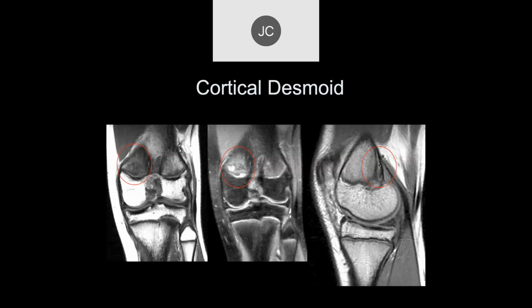What about the physis on the sagittal view? It doesn't look normal. Yeah, well, this is all kind of a stress reaction all through here. And in this particular case, it's involving a little bit of the growth plate. But again, these do very well with conservative treatment as long as they're recognized for what they are. Well, it's certainly not a typical fracture line.